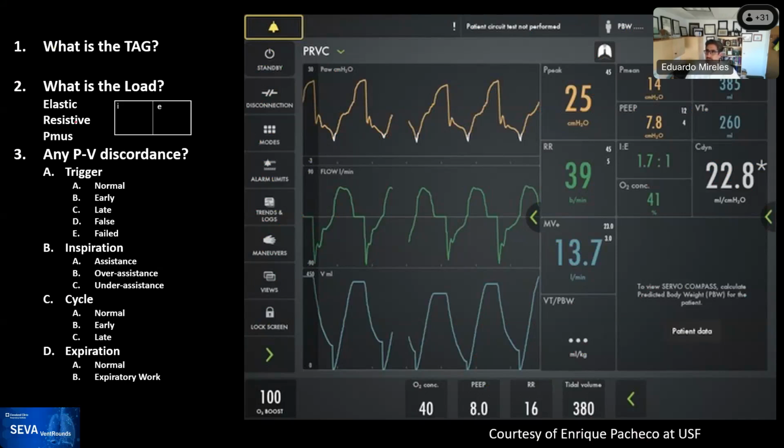If you want to start writing what's the tag that you see for this mode, and you can see that it's up here. So what would be the tag? And I start seeing people put it in, and excellent, yeah, high quality recognition. So this is a common mode that people confuse with volume control.